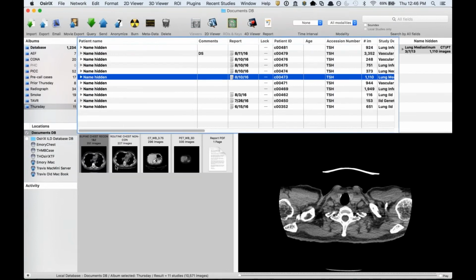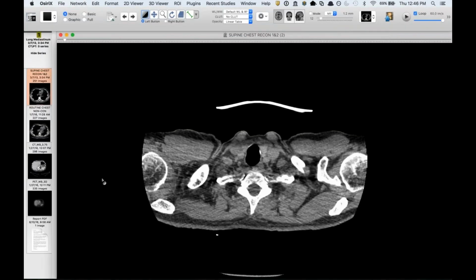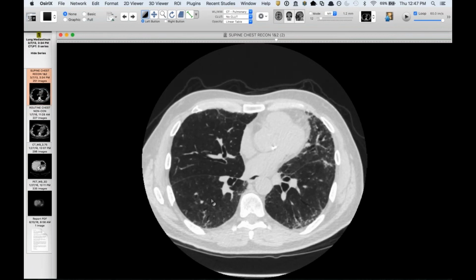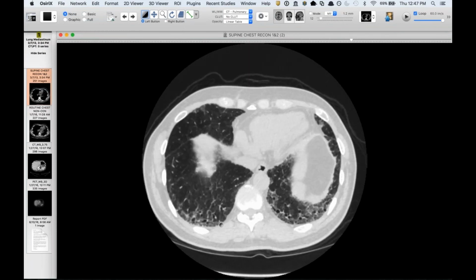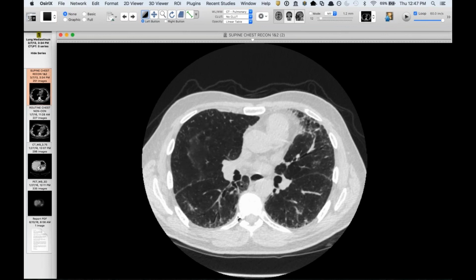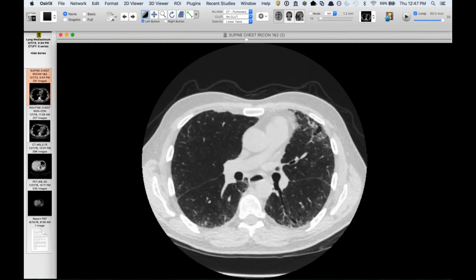I'm glad that Howard showed the melanoma sarcoid-like reaction case, because this is one where I'm not sure I buy the diagnosis or not. This is a man who has fibrosing interstitial lung disease, back in 2013. It was classified outside as a possible UIP pattern, so they went to biopsy, confirmed UIP, presumed IPF, and back in 2015 he was started on pirfenidone.